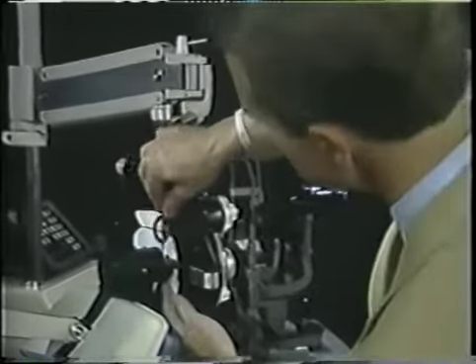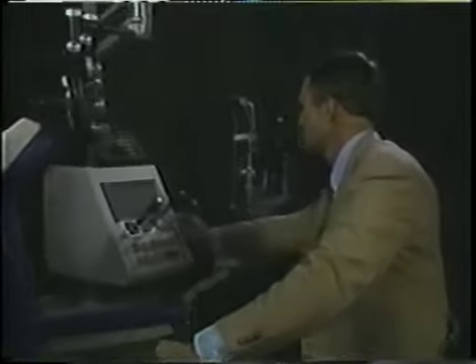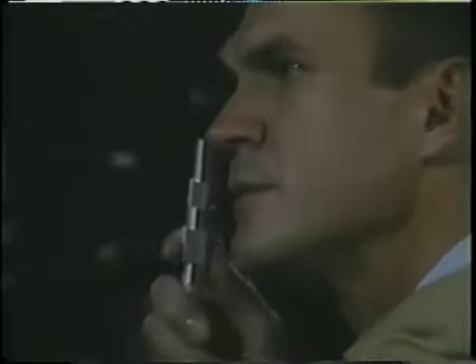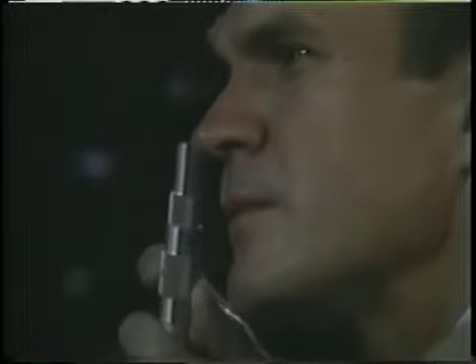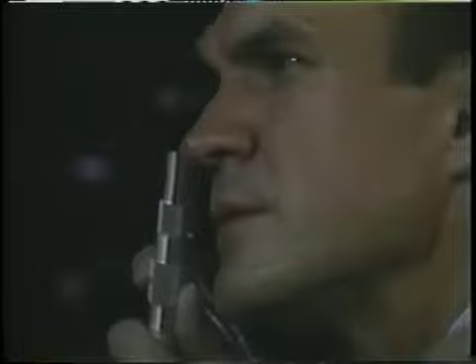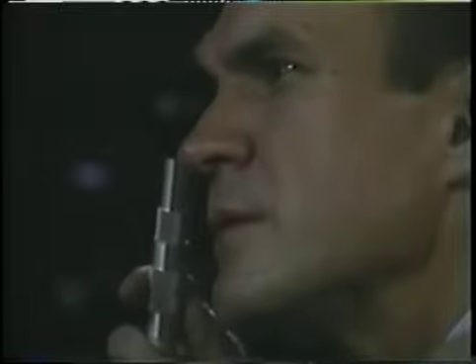Place a -1.5 diopter cylinder between the schematic eye and the phoropter, with axis approximately vertical at about 100 degrees, so the proper correction will be a +1.5 diopter cylinder, axis 100 degrees. Dim the lights and look for with or against movement. This time not only holding the sleeve all the way up, but also rotating it with thumb and forefinger to change the streak from one meridian to another as you sweep the intercept across the pupil.